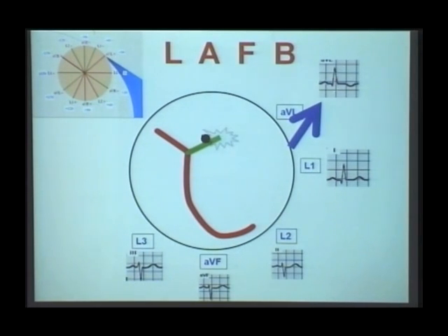deviation, with lead 1 and aVL being the tallest, with a small initial negativity here. And you can see the three inferior leads have a small initial positivity and significant terminal negativity, all three leads looking exactly similar. So this is what happens in left anterior fascicular block. It is the commonest cause of left axis deviation.